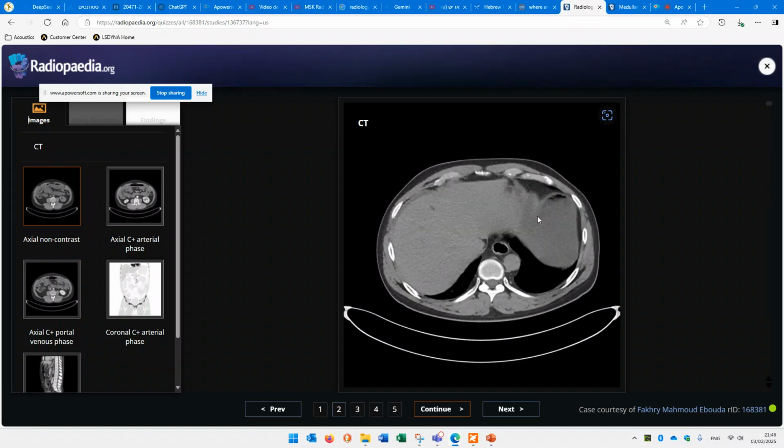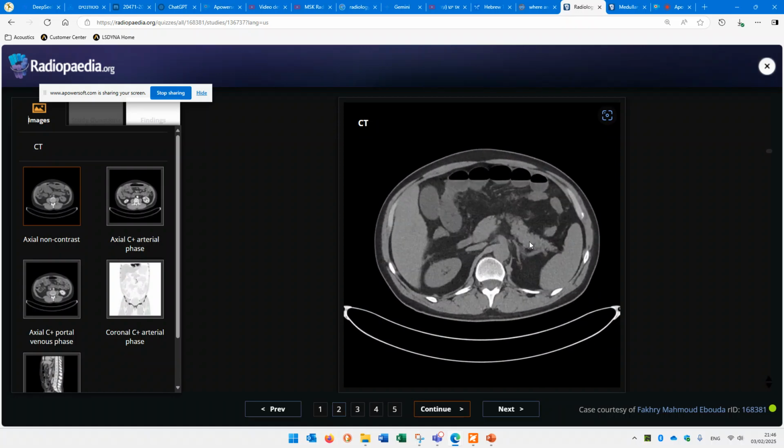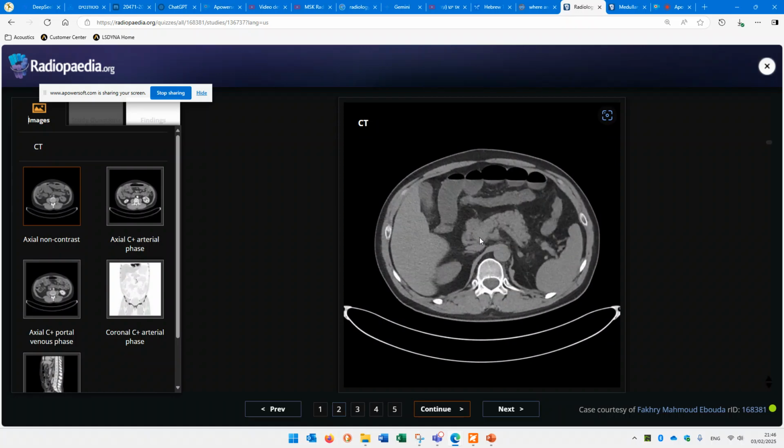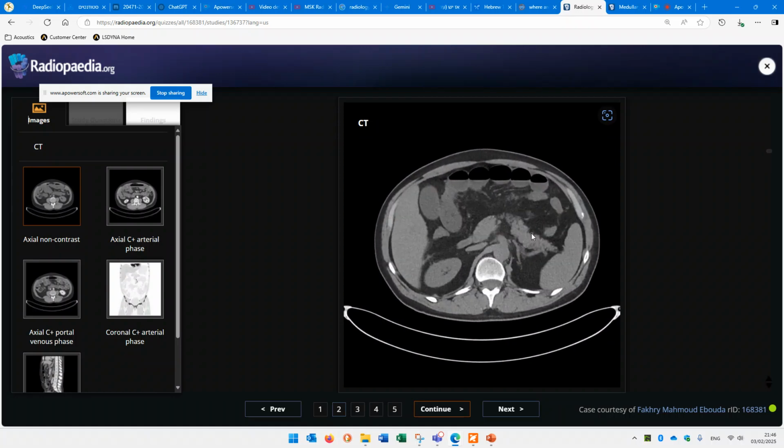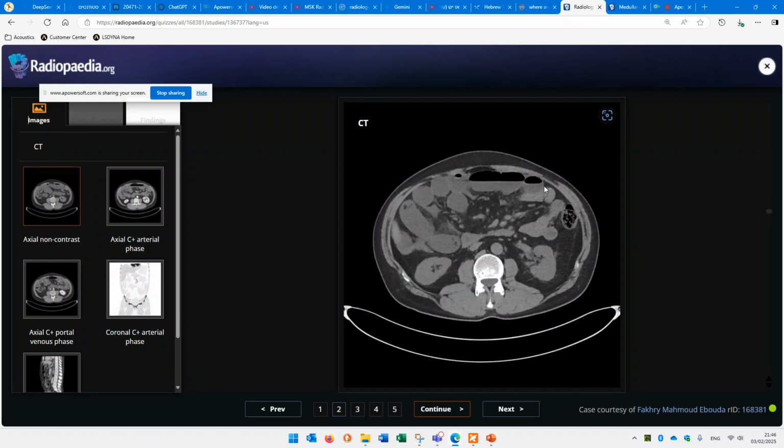What about the stomach? Pretty dilated. Maybe ate something. Okay. What about the pancreas? Epigastric pain, but I don't see any pancreatitis. The pancreas looks fine. No fat stranding. No edema. Okay, so the pancreas looks quite fine.